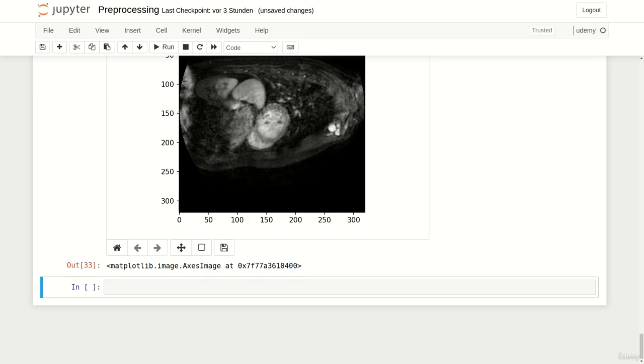If not already done, I highly recommend to take a look at the provided Python notebook, because it contains some more detailed explanations and also an excursion about the reorientation of three-dimensional volumes. In the next lecture series, we will combine everything we have learned so far with a convolutional neural network to detect pneumonia in X-ray images.